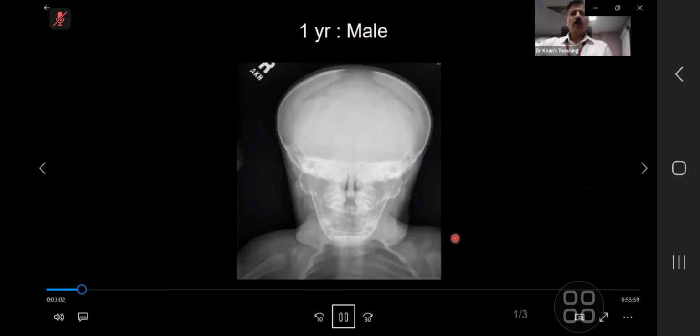Right. Okay. So if you see here, in this particular case, look at the clavicle, and part of the clavicle is not well formed, and part of it is hypoplastic. Even the scapula, particularly look at the glenoid, is small. If you look at the skull, these are Wormian bones. You see this fontanelle is open.